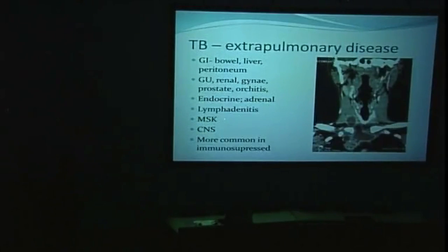MSK presentations, not unusual, particularly in the spine. Pott's disease, osteomyelitis of the spine, and discitis of the spine. Often communicating or extending laterally and involving psoas muscles, so you can get a psoas abscess, which I have an example of in a minute. CNS involvement also, you can get a meningitis, or actually tuberculomas within the brain, which I'll show you in a minute as well.